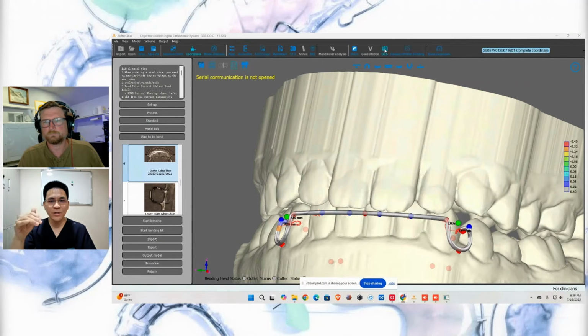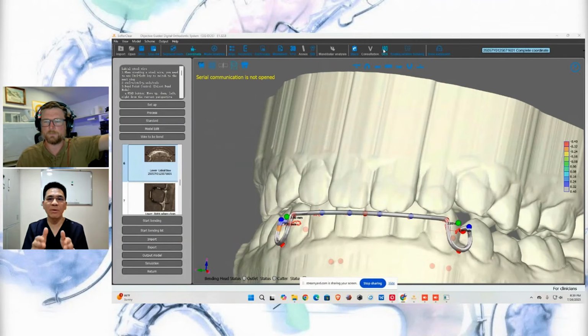When you finish the case, you want to know whether the case is good or not. So you can do the digital ABO OGS, the objective grading system of the American Board. Before this, you needed to do this job by hand, and now it will do this directly. All of it digital.